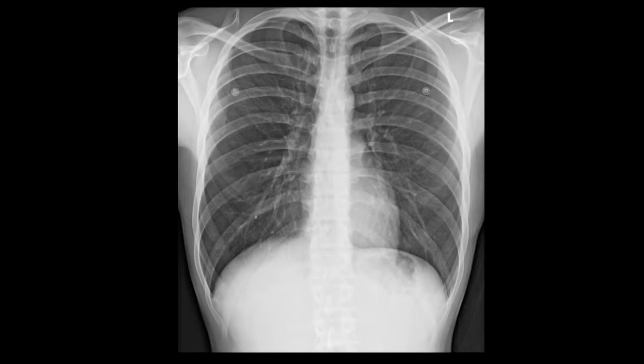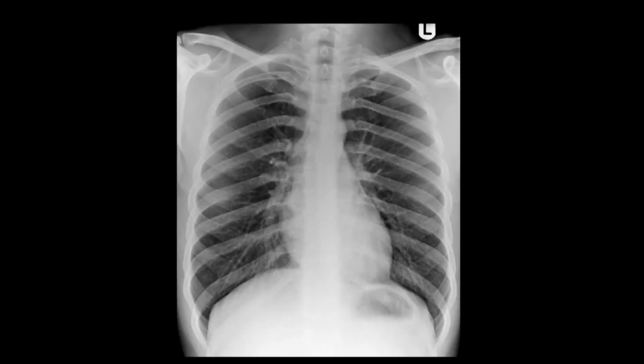So here we have an example of a chest x-ray, and you're looking specifically for the gastric bubble. You can see that the patient has gas within the fundus of the stomach, and that's below the left hemidiaphragm, so they have a normal left-sided stomach bubble. The next patient, this is an erect film, and you can see that the gas fills the superior portion of the stomach, and again you can see that the stomach bubble is left-sided in an appropriate position.